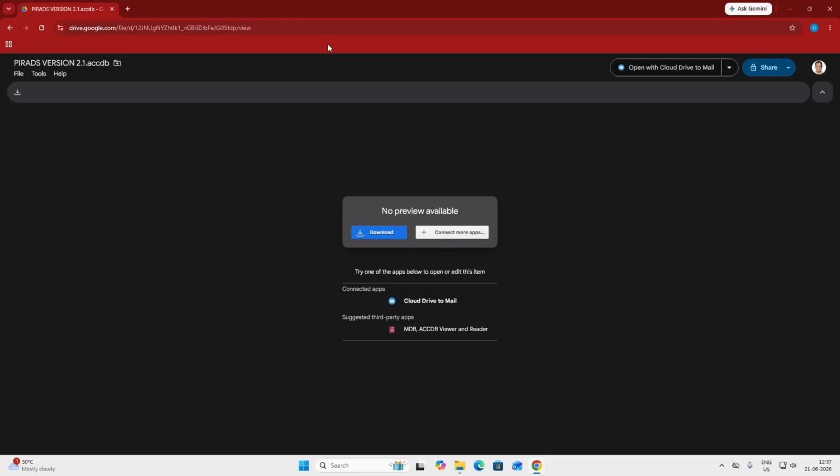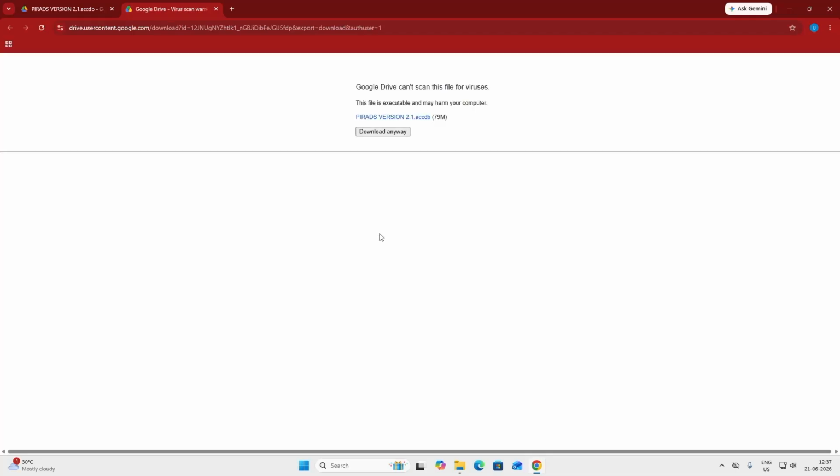Download this application from my Google Drive. Click download. Click download anyway. And in a few seconds it is downloaded.